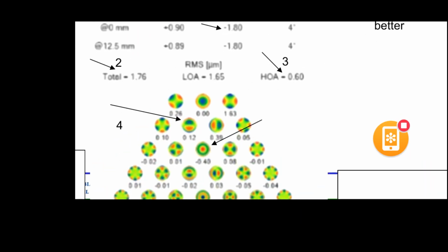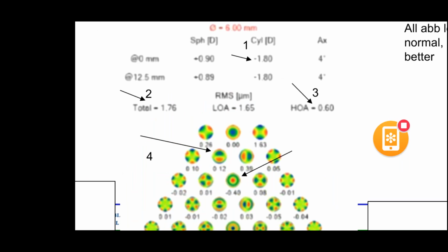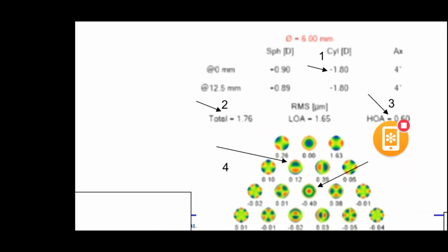And then when you're looking at the Zernike polynomials, what I usually look at is this one over here, this is vertical coma and this is spherical aberration. Horizontal coma. Okay, now you can look into all the numerical values below over here. You have asymmetry, trefoil, tetrafoil, so many things.